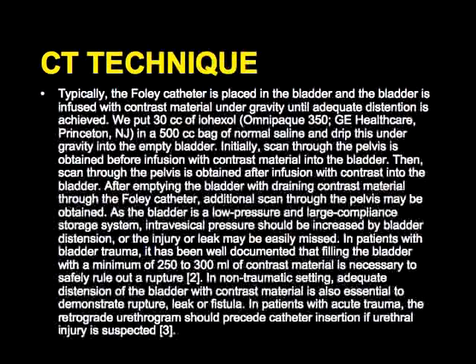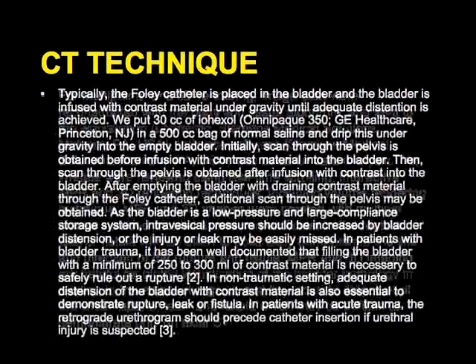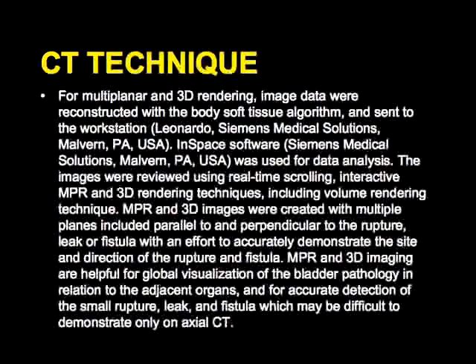Now, since we do have thin sections, we'll send it to the workstation. We'll use a combination of multiplanar reconstruction, particularly the sagittal reconstruction works well, and then volume rendering. I will, of course, look at the axial imaging, but the combination of these two techniques indeed is a very simple way of doing things.